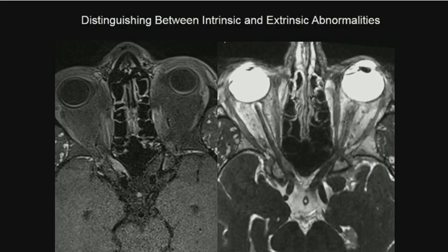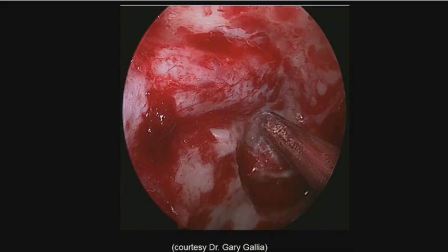It didn't quite fit clinically, however, and the patient was referred to us for high-resolution imaging. And here we can see on the right side, on post-contrast fat-suppressed, in this case T1 SPACE imaging, a mass with dural tails on both sides. In the axial post-contrast CISS imaging, you can see that this mass actually deforms the adjacent optic nerve in the optic canal. And here the arrow is pointing towards the mass. This is therefore not optic neuritis and was taken to surgery.